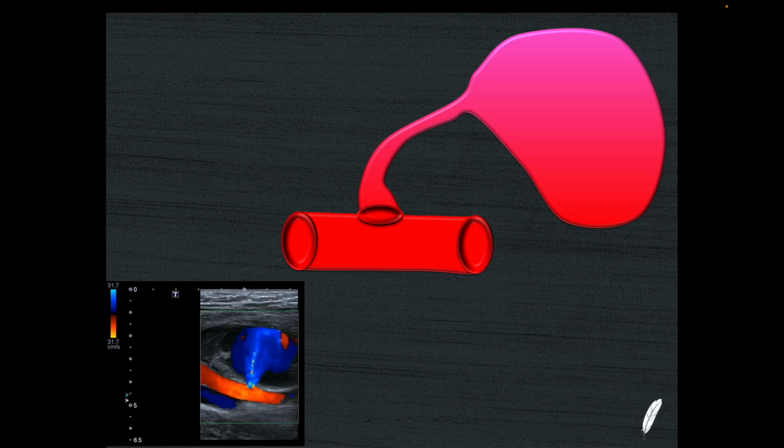As the needle goes into the artery, it of course punctures the wall, but then when the needle is removed, we have a leak from the vessel wall here. And this leaking vessel then pushes blood out through the artery into the soft tissues, and it forms like a little sac, and we call this a false aneurysm sac. Now if you look at the haemodynamics that you have inside of a false aneurysm, it's quite different to the other circulations that I showed you.